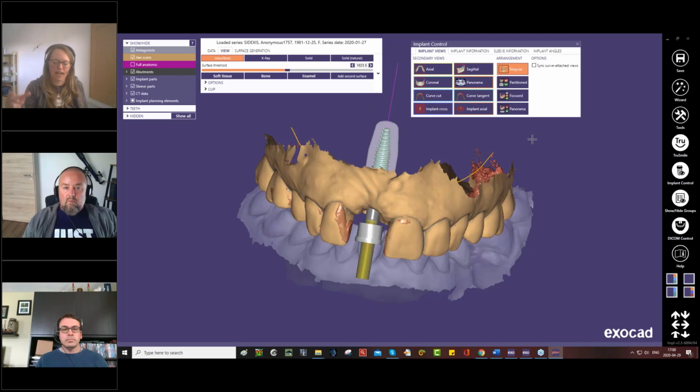And then you scan the radiographic guide alone in the CBCT scan. Then in exoplan, you load both of these DICOMs and they are matched over the radiopaque markers. Through that, you have the position of the gingiva, which is not visible in the patient X-ray because it's so soft, low density. And then you can use the radiographic guide in your design.